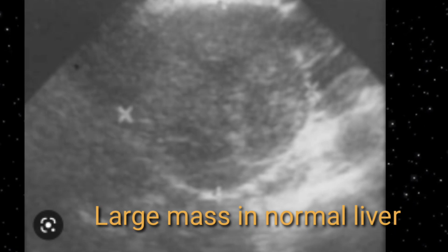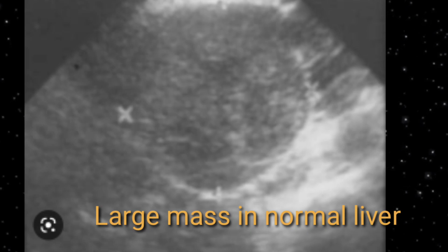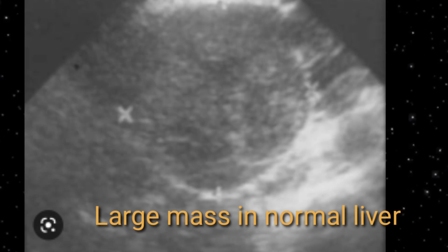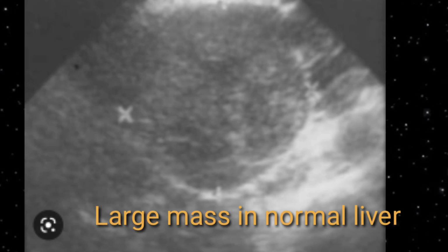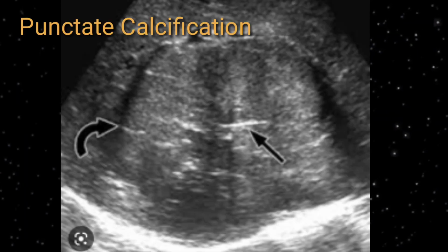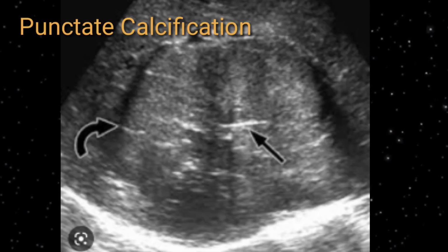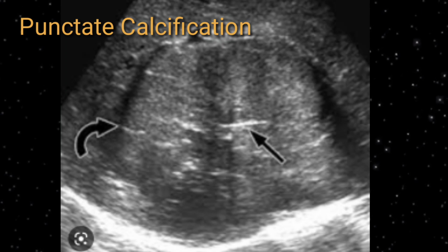So you will see a normal liver on the ultrasound. The mass would be large, ranging from 6 to 22 centimeters in size, and within the mass you would see central scarring and punctate calcifications. Here on this image you can appreciate a large mass. There is a normal sized liver.